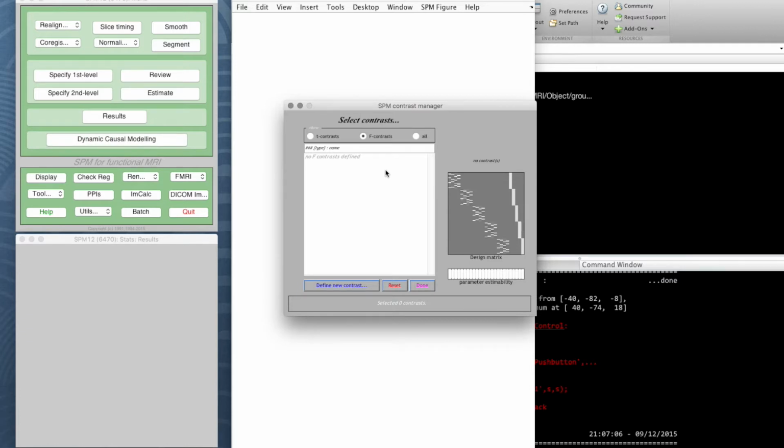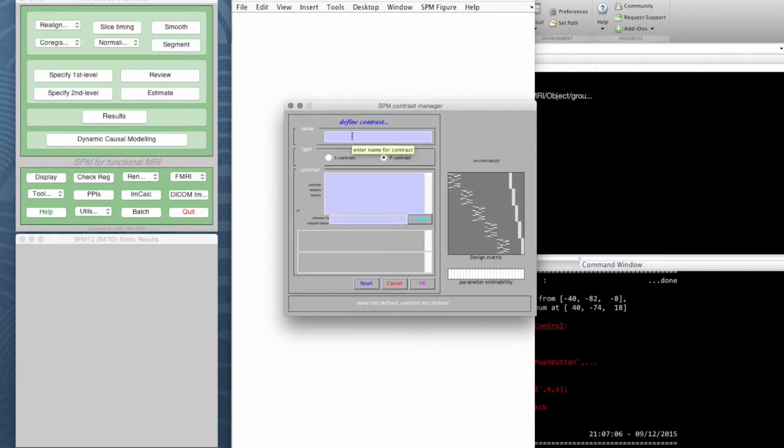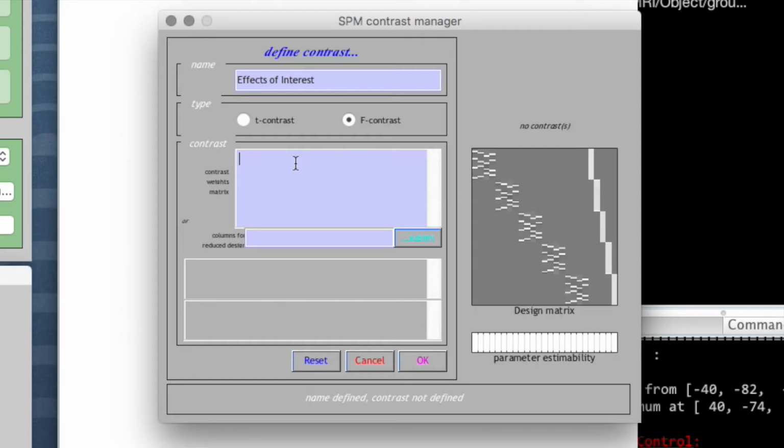It's signless. So what we can do is try and recreate SPM of old, where by default, when you did statistics, SPM would come up with a contrast called effects of interest, and this puts just as a multiline F contrast with a weight of 1 on each condition or regressor in each line.